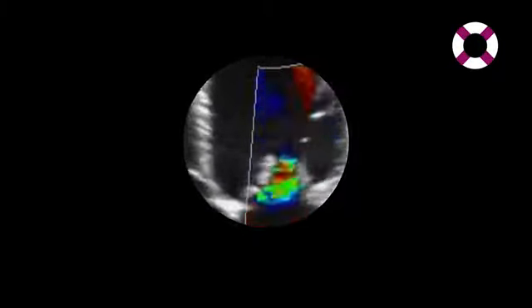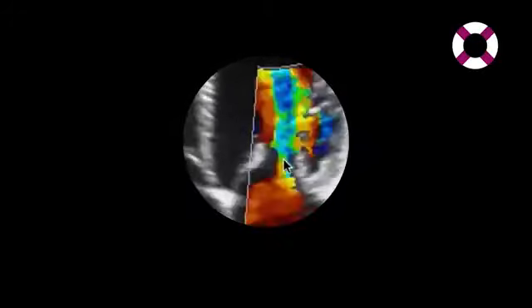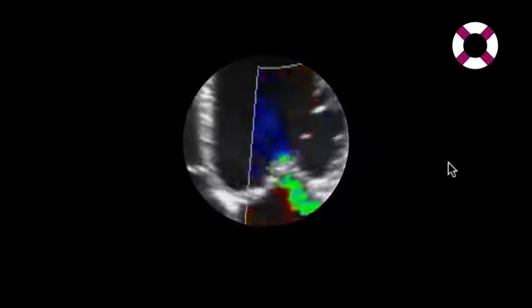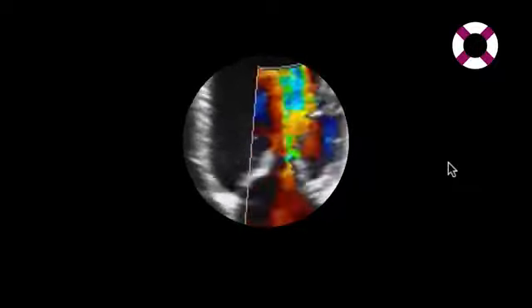The same is true for echocardiography. If we have a regurgitant orifice right here, we also have a flow convergence zone. This is the little area here. Note how we have higher velocities right at the center and lower velocities in concentric shells further outward. And the larger this flow convergence zone is, the more blood will pass through the mitral valve and the more mitral regurgitation will be present. So always look at the size of this flow convergence zone.